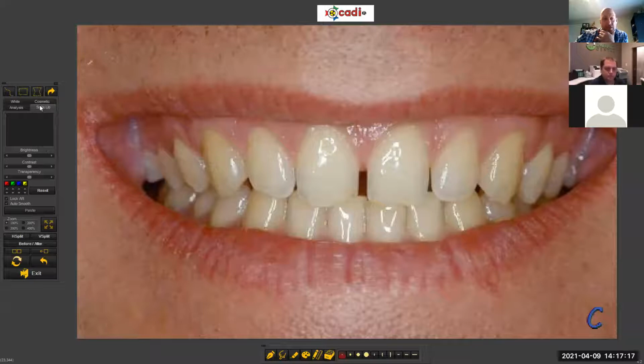Normally we have, this is your smile library. You would click here and have a whole bunch. You would double click on the type of smile, since they had a variety of different teeth shapes. Then it would open up this huge library of smiles, and you would choose the one you'd want to impose in the selected area. Then you would size it and ratio it based on the center lines.